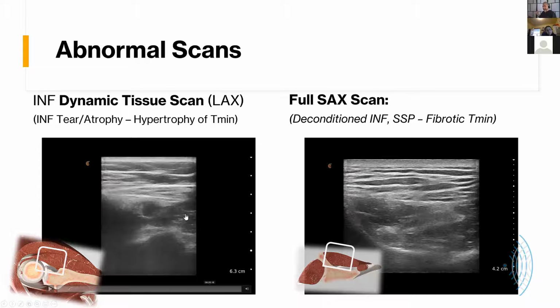Now that's our backup muscle. It's an external rotator, so it's a backup muscle for the infraspinatus. And in her case, because of all this fatty infiltration and the fibrotic material, she was simply not a candidate to reattach the infraspinatus, and the teres minor served as an able backup for that. Here we have, in her case, infraspinatus atrophy and teres minor hypertrophy.